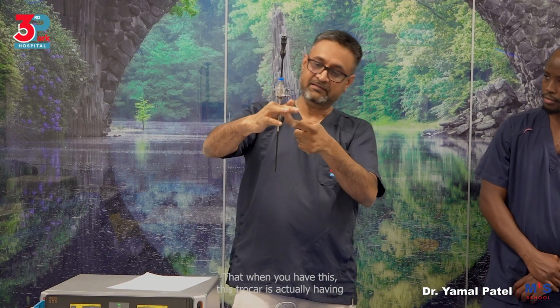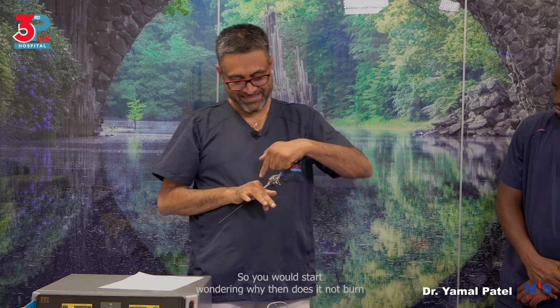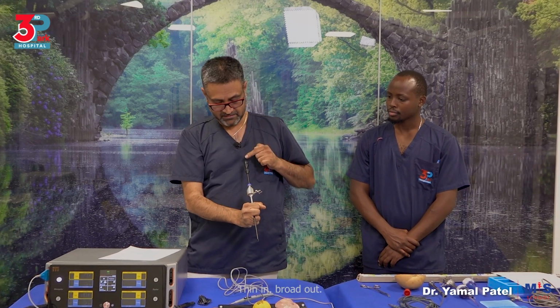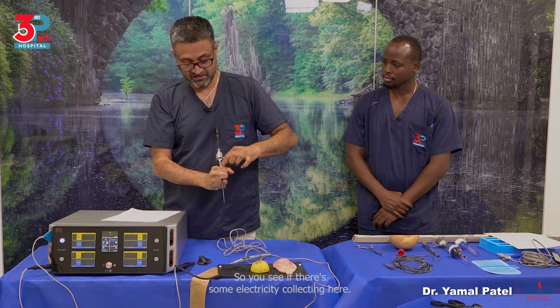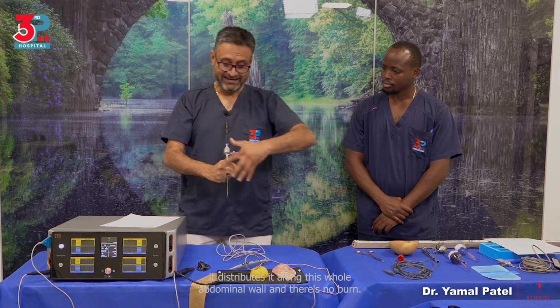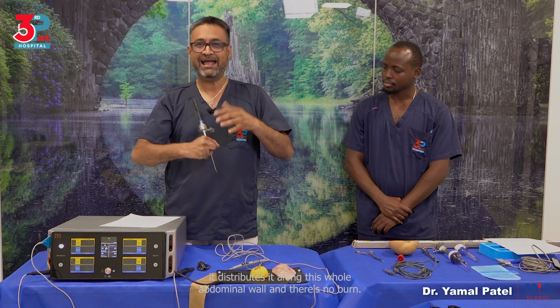That when you have this trocar, it is actually having electricity going through it and collecting as a capacitor. So, you would start wondering, why then does it not burn this patient's abdominal wall? Well, it does. But remember, if the abdominal wall is a bit wide, so for example, it's that wide, then you're talking of thin in, thin out, burn. Thin in, broad out. So you see if there's some electricity collecting here, but this is a broad surface that it is touching the abdominal wall. It distributes it along this whole abdominal wall, and there is no burn.